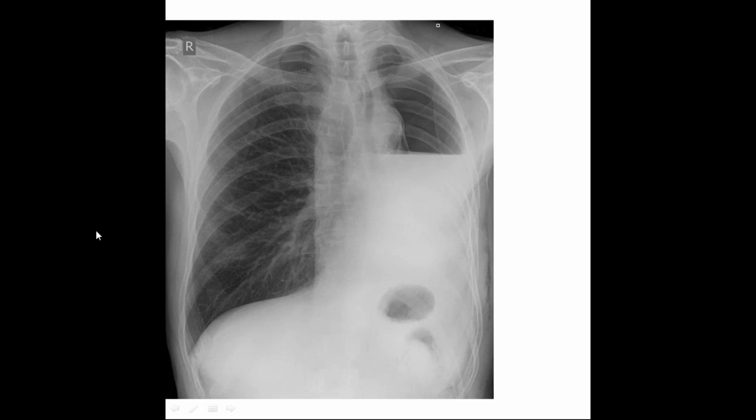Infection is correct, but then we have to be more specific. But which malignancy can cause a pyo or a hydropneumothorax? I am not aware of any malignancy which can present like this. Thoracocentesis done wrongly. Okay, yes.